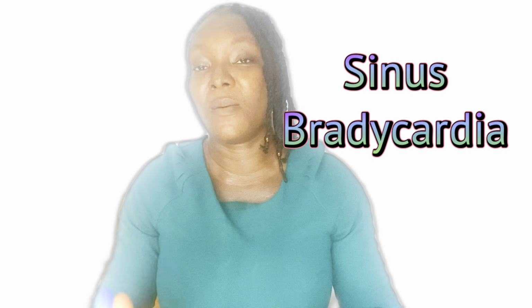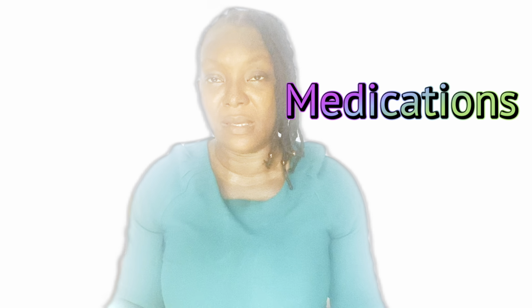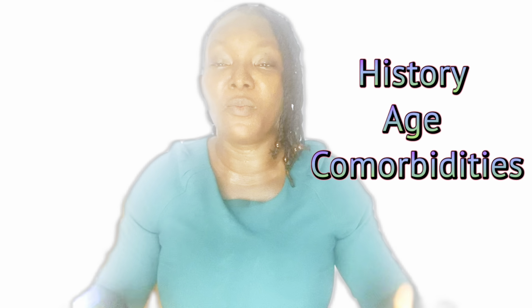Now, sinus bradycardias are usually not problems. Sometimes they are pathological, sometimes they are not. Sometimes they are just responses to some medications, like some antihypertensives, or there are some athletic people who naturally have bradycardias, and then it is not really a big deal. So these things are not diagnosed in isolation. Okay, you need to take into consideration the patient's history and the age of the patient, other comorbidities if there is any, before you conclude on what exactly the problem is.